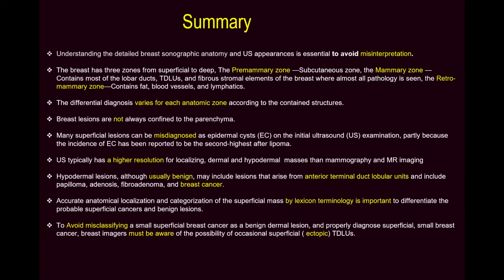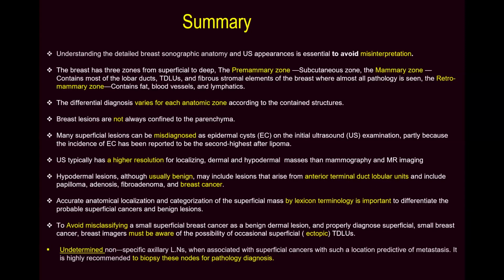Breast imagers or radiologists must be aware of the possibility of occasional superficial or ectopic TDLUs. An undetermined or non-specific axillary lymph node, when associated with superficial cancer in such a location, is predictive of metastasis. It is highly recommended to biopsy these nodes for pathological diagnosis.